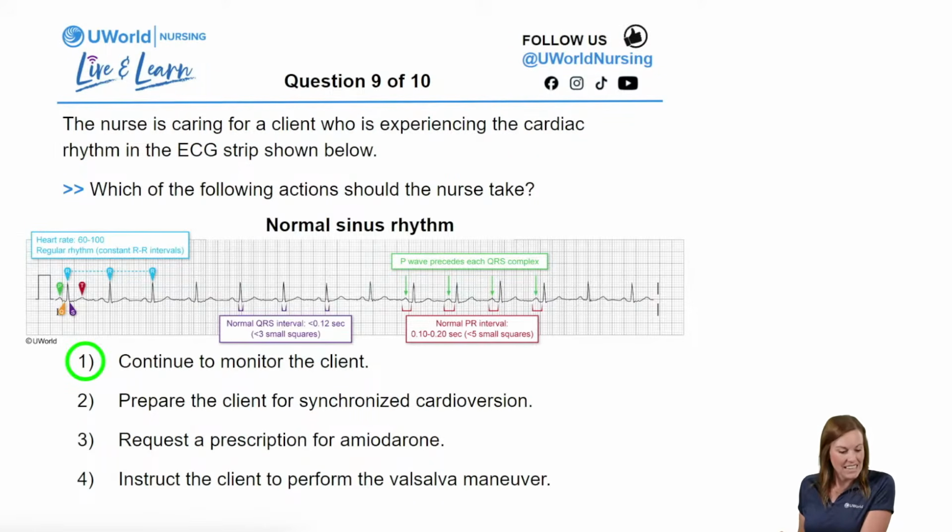So what you guys are seeing is normal sinus rhythm. So we're just going to monitor the client. Nothing to do here. Maybe this was a little bit of a trick question, but it's important that you guys can recognize normal sinus rhythm.